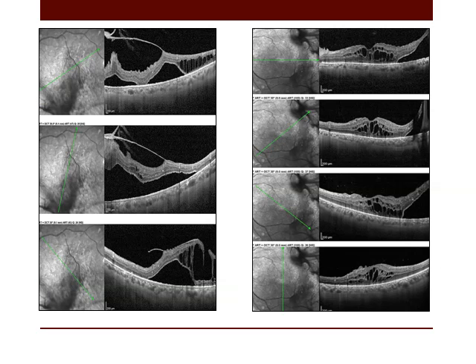Again, vitreomacular interface abnormalities can result in tractional retinal detachment. In this case, it is involving the center of the macula. In this case, it is threatening the center.